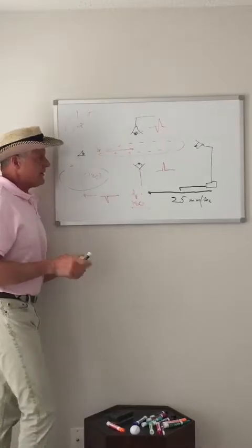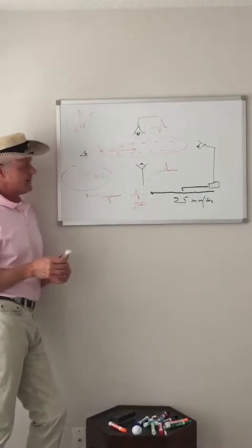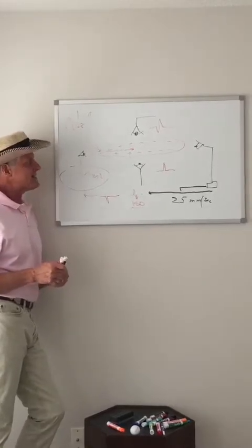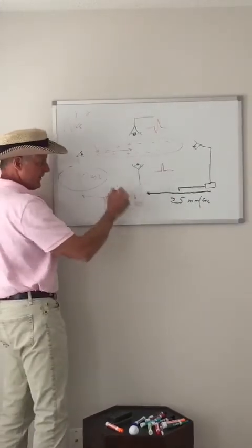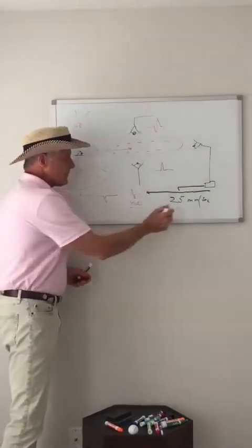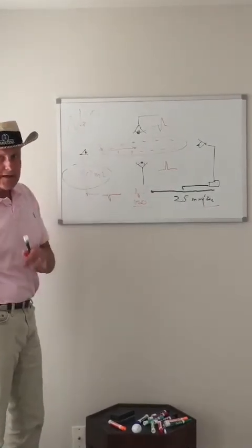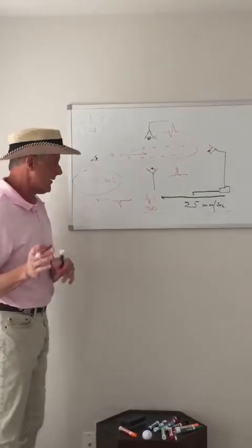So we're going to take this two little steps further. You have to ask yourself two questions. That's fine, I understand that. But what determines the width of the QRS complex? And this is representative of a QRS complex. What determines how wide it is? Well, if the paper speed remains 25 millimeters per second, and people do change them, EKG techs accidentally change them, so you have to watch it and you have to know it.